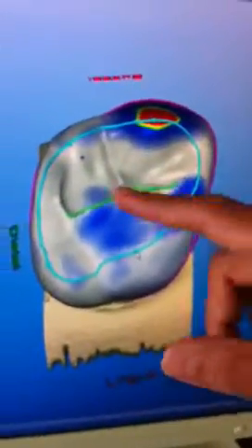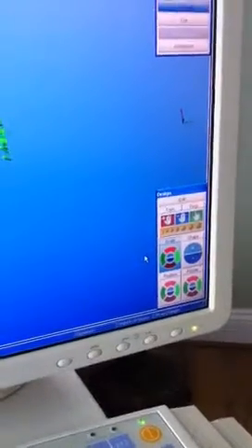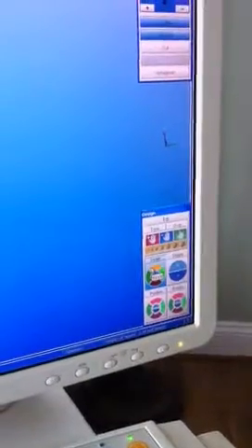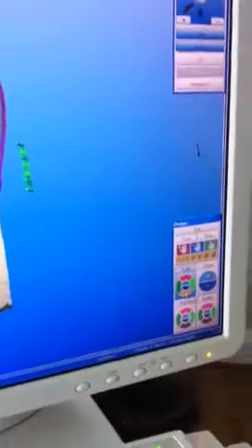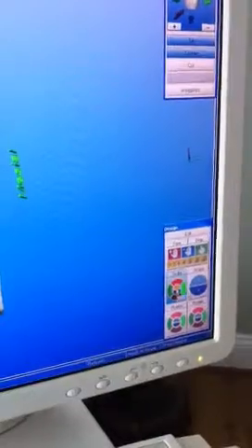If I want to adjust the lingual mesial cusp by itself, I would click on this little dot on the cusp line. Do you see how it changed, and now the area that's highlighted is basically over that cusp? So if I wanted to bring it more occlusal, I would go over to the scale. If you ever have a question on where it's going to move the tooth structure, just leave the cursor on top of the actual button. That would move it more buccally. This would move it more lingually. And this is cervical, so that would bring it down, and this is occlusal, so it will bring it up.